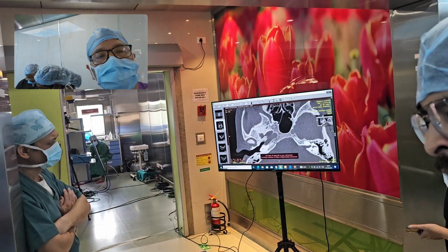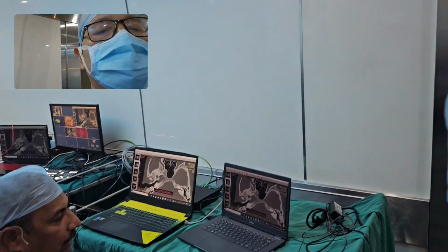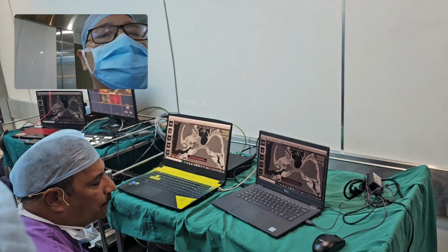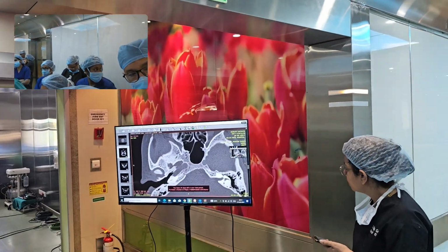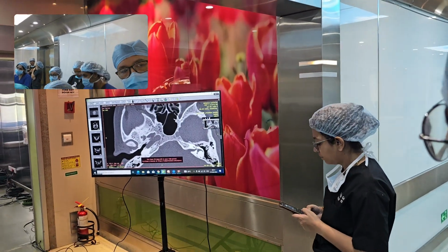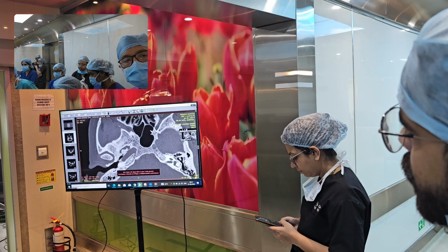Many times in otosclerosis surgery, a facial overhang can make your life difficult. And the CT scan gives you a complete insight about the facial nerve labyrinthine segment. This is the first genu. This is the GSPN going anteriorly and the facial nerve going behind.